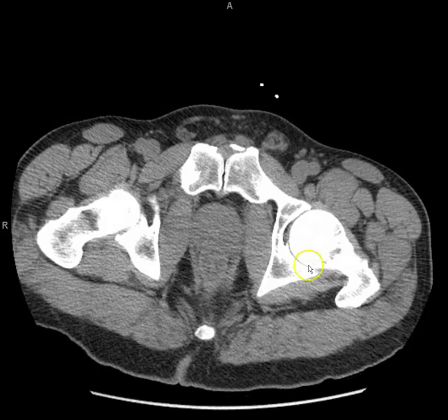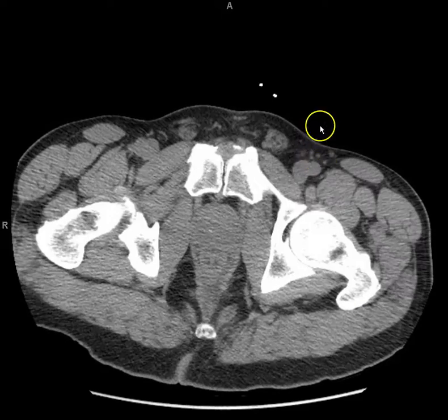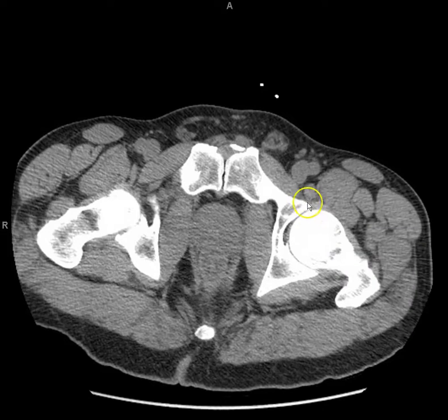Okay, what's this? Femoral head. So this is a landmark Dr. Ben-Zur uses when he's trying to do angioplasty. How do you find the femoral artery if it's calcified? You can't feel the pulse. Or how do you find the vein, right? So if you go straight down to the femoral head, the middle of the femoral head, you're usually right on top of the artery. So when he's in there using fluoroscopy, that's what he's doing.